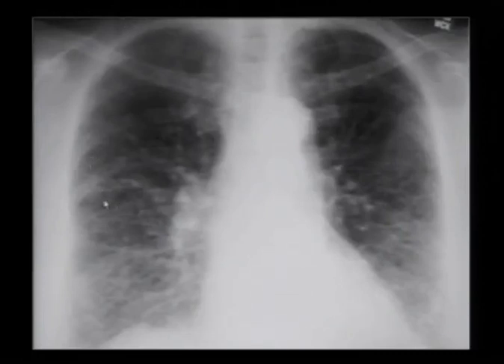I see a lot of linear elements and reticular elements in here, and of course where lines cross, they can create the appearance of nodules. That's why it's so nonspecific. I think one of the important things to recognize is that the lung volumes are relatively maintained. This looks like an interstitial appearing radiograph. And a lot of things that infiltrate the interstitial, particularly that are linear and reticular, tend to be restrictive. They tend to restrict lung volumes and make the lung volumes small. So it's somewhat peculiar that these lung volumes are well maintained.